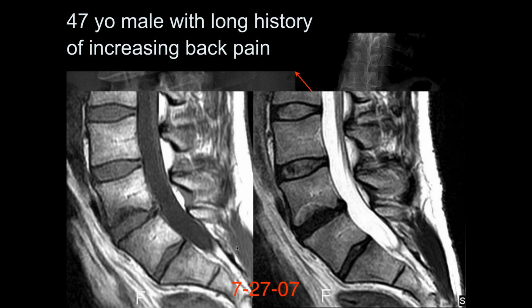So here's the MR. Okay, it looks like there's degenerative disease at L4-5, L5. So there's degenerative disease at both levels. Usually with this syndrome, the 5-1 is okay. But we can see degenerative disease here, a lot of end plate changes at the 4-5 level.